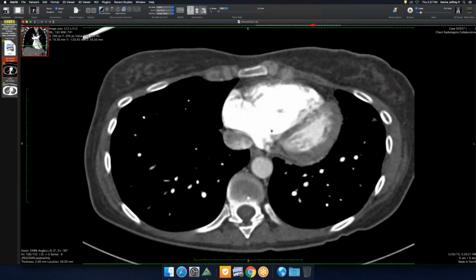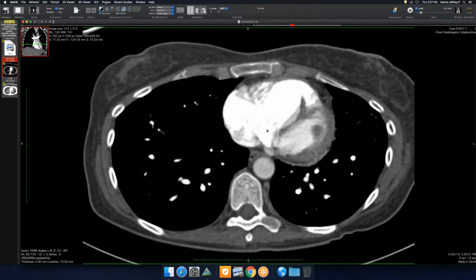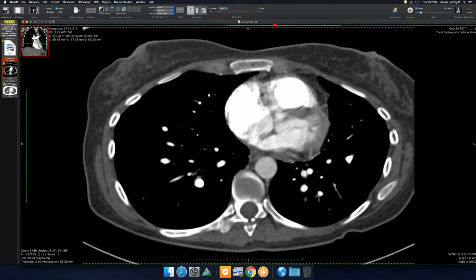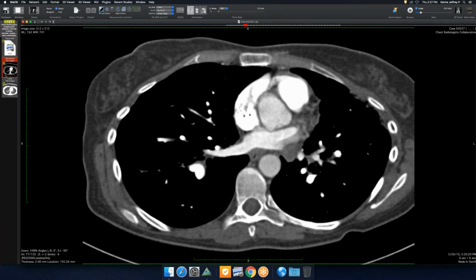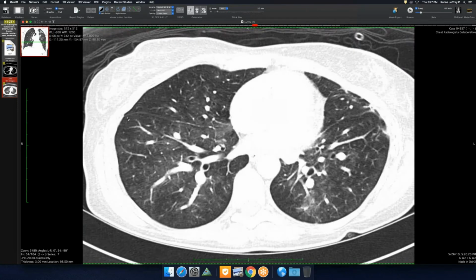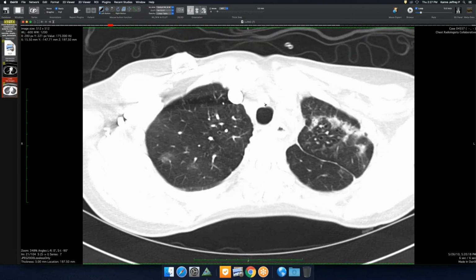And this was acute. I think she had a previously normal echo when she was getting her first chemotherapy. I can't remember if it was a biopsy or an autopsy. I think it was a biopsy. They found tumor. She's got what looks like maybe some tumor down there. So as Howard was mentioning, it's the mosaic attenuation pattern. But she had a known malignancy. You can see she's been treated for breast cancer up there. But yeah, it was rapidly progressive.